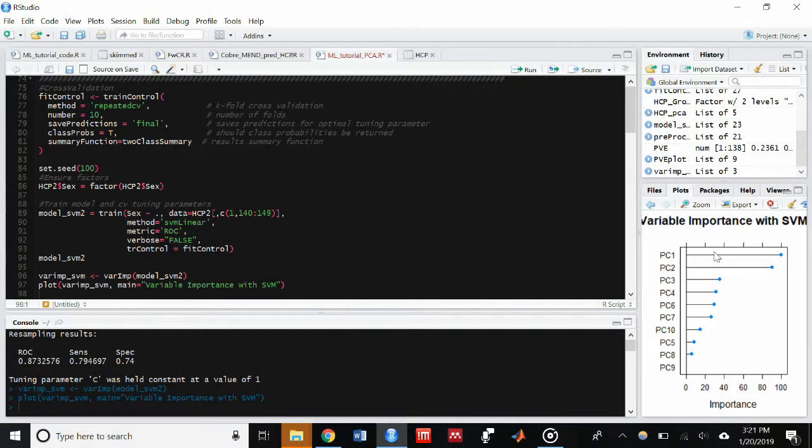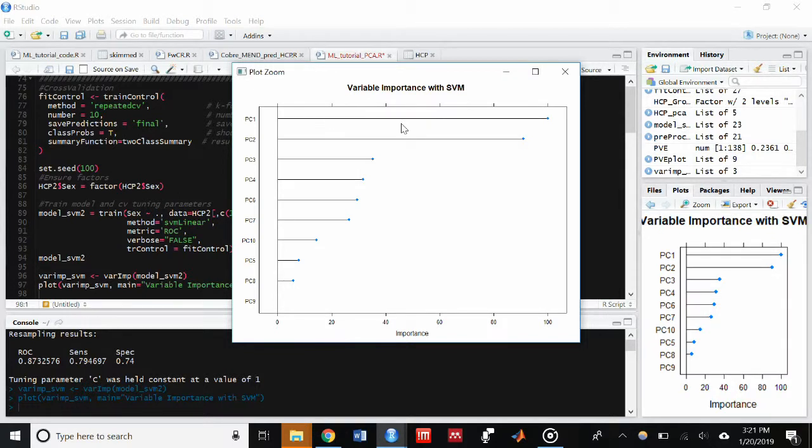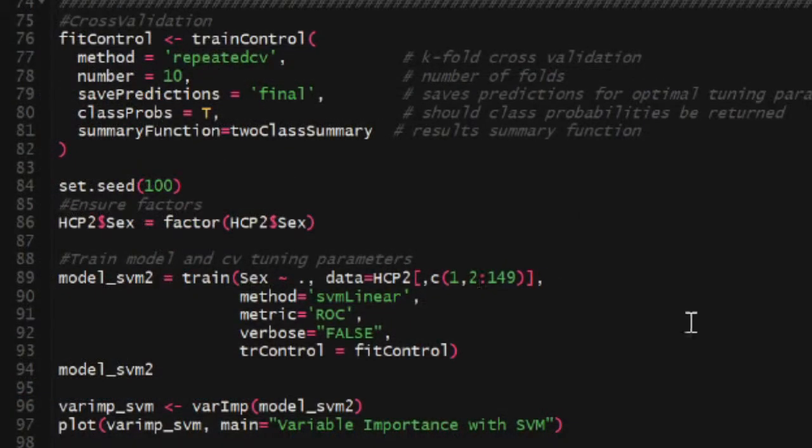So that's good. Let's take a look at the lollipop graph. The lollipop graph is interesting and turns out how we would expect it to. PC1 being the most important for the model, and for the most part, the other PCs are in order. This won't always be the case in your model. Sometimes it will think PC3 is the most useful feature in predicting Y. It's important to pay attention to this graph because it can tell you a lot about how good your PCA is working or if you need to try something else.